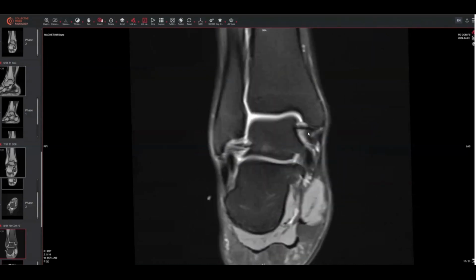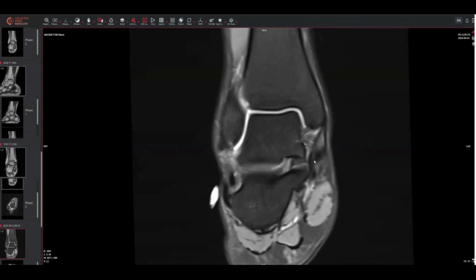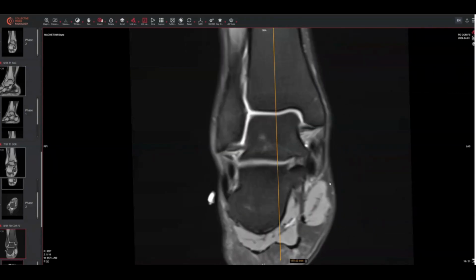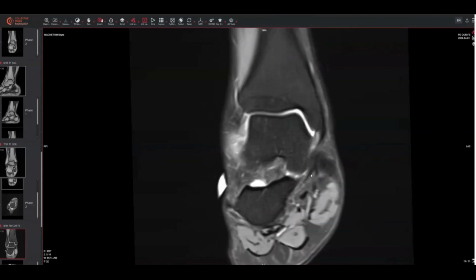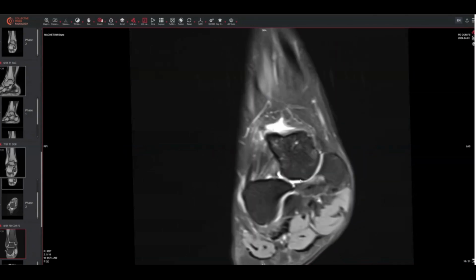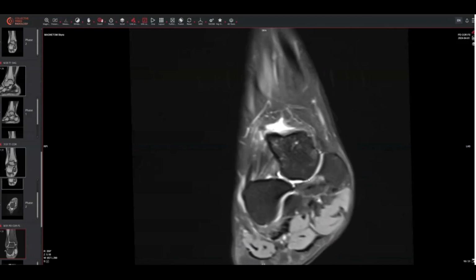Let's appreciate the sprain of that posterior deep deltoid with its interstitial edema. The superficial deltoid, I can see a portion of the tibiospring. Again, these are thick slices, so I want to look at that again axially. I can see some of my flexor retinaculum here as it attaches to my abductor hallucis. The region of my superomedial band of spring ligament as it attaches here. And then we're moving along the medial talar head to the medial plantar and inferior plantar bands. Just noticing as you stop here the faceted nature of this talus. That's not the normal configuration, but we'll get back to that.